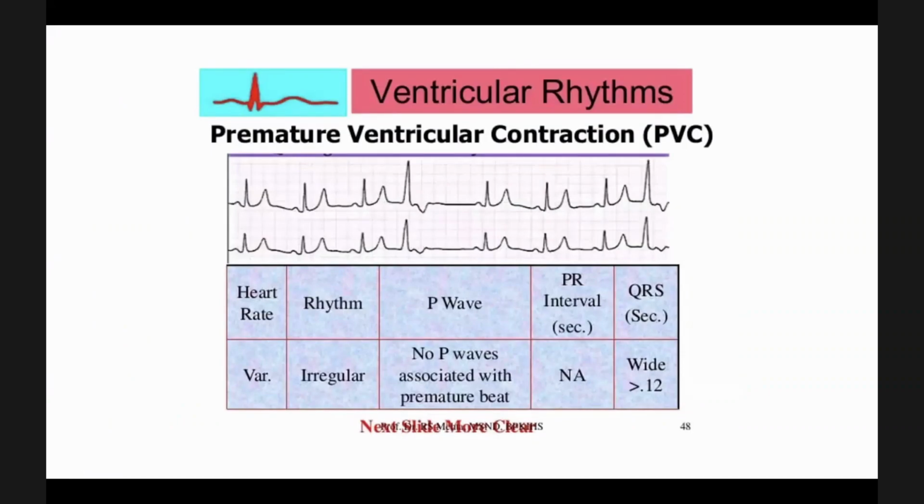That is all about this. There are other ECGs as well, the multifocal atrial tachycardias and wandering pacemakers. Those ECGs I could not add, but try to see those ECGs as well. Wandering pacemaker is one thing, and also the multifocal atrial tachycardias. Can you all write them down and see those ECGs? Okay, and now we'll move to the ventricular rhythms.